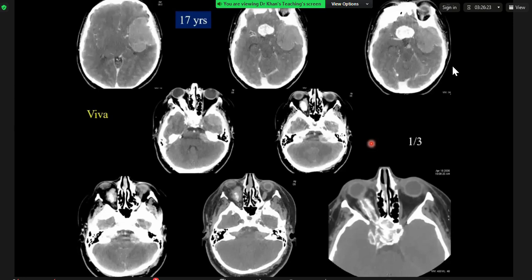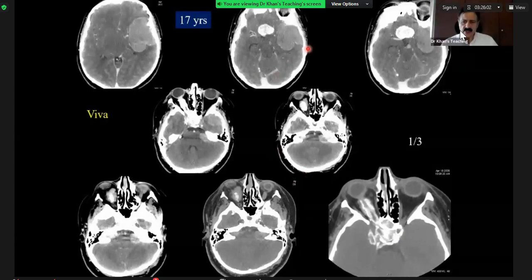And based on these two findings, this patient has got meningioma and cerebellopontine angle masses. This could be NF2. I would like to see the spine as well, to see if the patient has got any ependymomas there. So what has been picked up is that there are multiple.